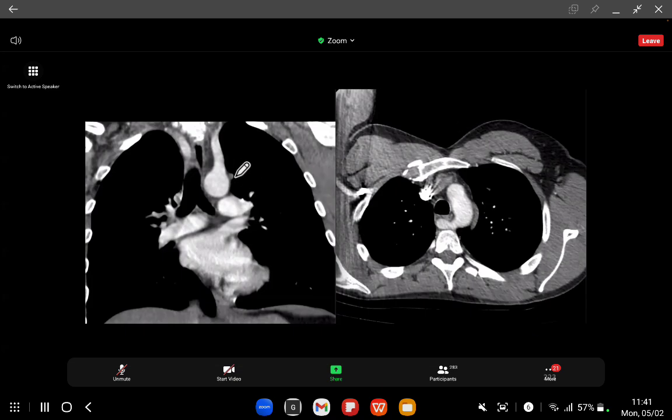Okay, what do we call this on the chest X-ray? There's the aortic knuckle, there's the left subclavian artery, and we've got the left superior intercostal vein, and this is called the aortic nipple, okay? And the aortic nipple becomes more prominent when this becomes engorged in SVC obstruction.